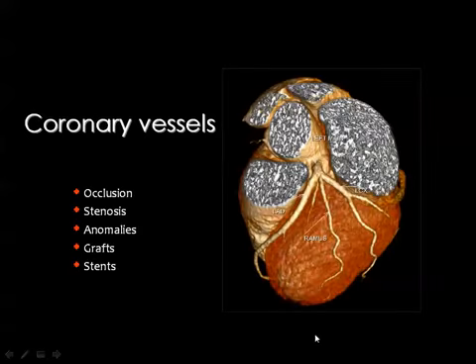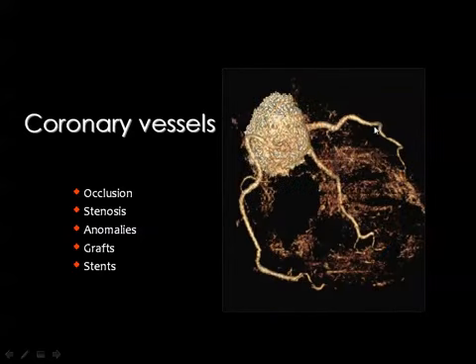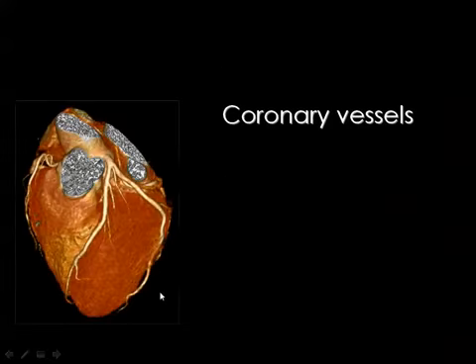with other branches. Also, you can assess the coronary vessels like this one, and this is an image of the coronary circulation obtained by CT scan with 3D reconstruction and color imaging. Then you can remove the cardiac muscle in order to see clearly the coronary vessels as well.